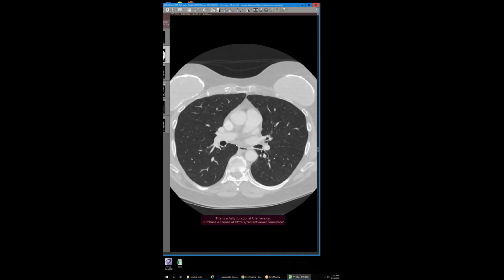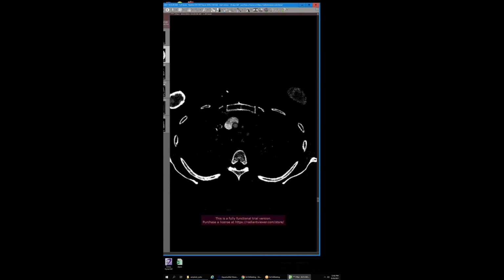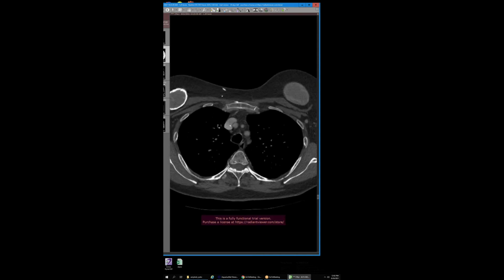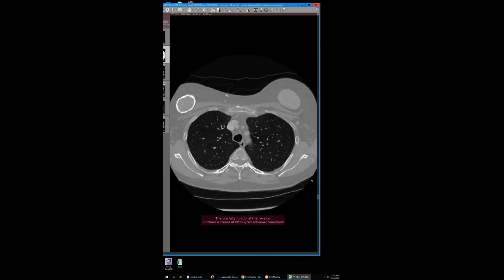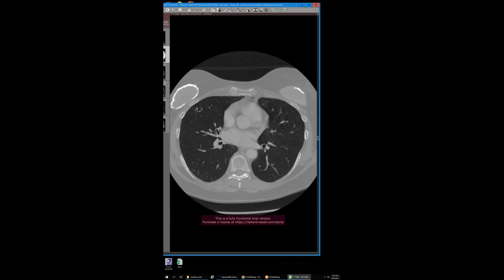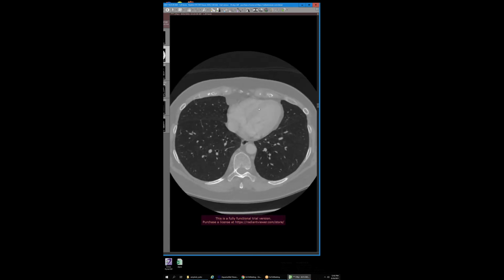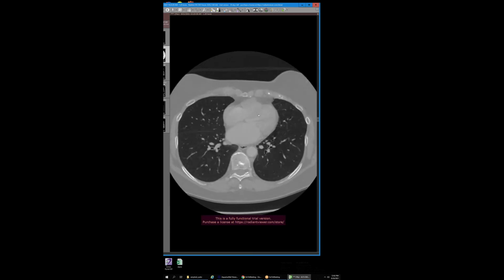Yeah, the little ossification. Yeah. In those, easily. Because if you look on windows, they're amyloid ossification, calcifications, I'm not even sure what they are. But that's all she had. She didn't have any other nodules, no cysts without those areas, and without those kind of calcified thick nodules or ossified thick nodules. So other people have seen that.